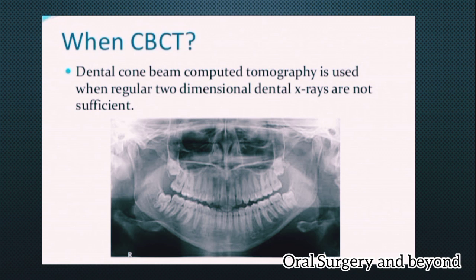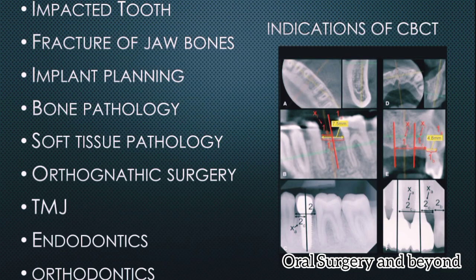So for more accurate diagnosis, we proceed to the CBCT, right?